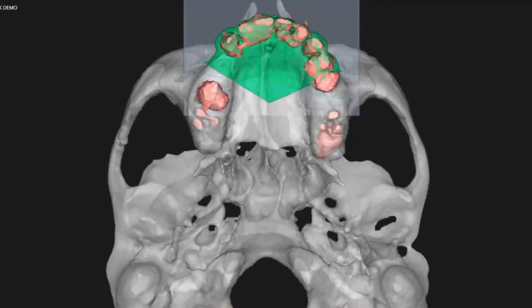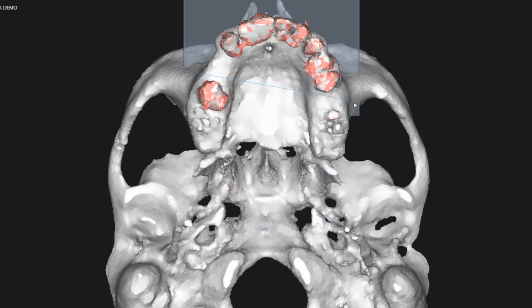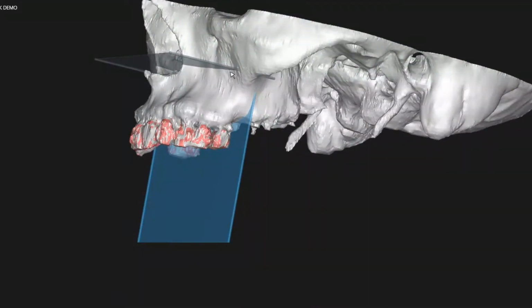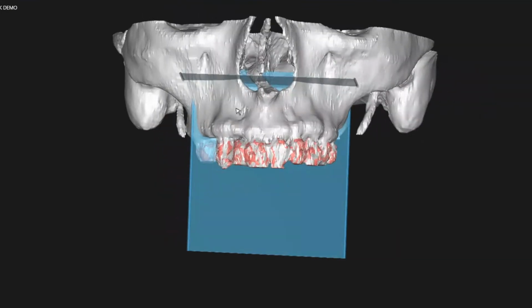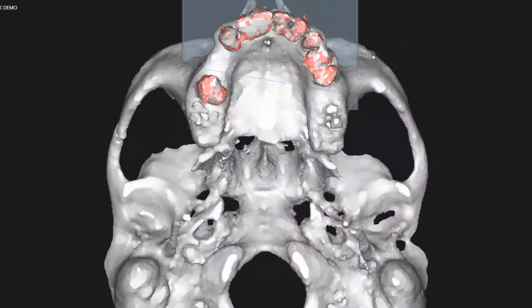All right. Let me hide what we previously resected, and I'll show you. It'll be kind of an angled cut. Yeah, that's fine. And then coming through here, do you want another plane right in front of the zygomas? Again, it's a straight plane. It basically mirrors that black line you just had. So it comes right across and drops posteriorly, inferiorly to meet those cuts. That makes sense.